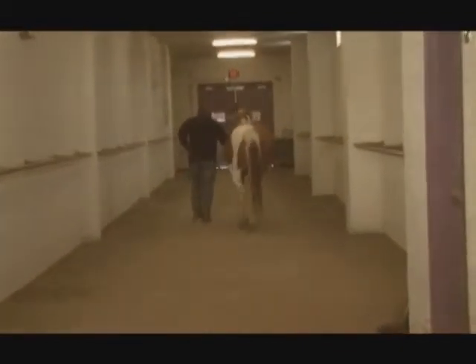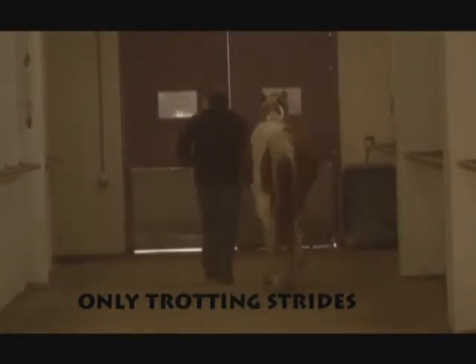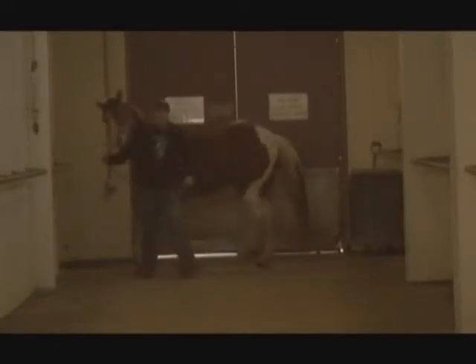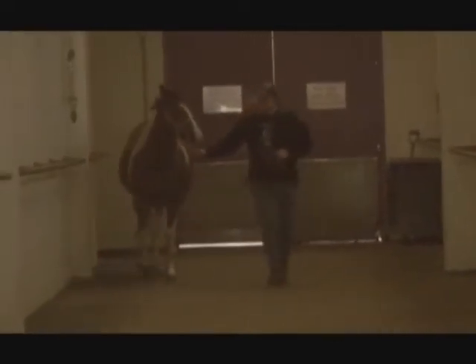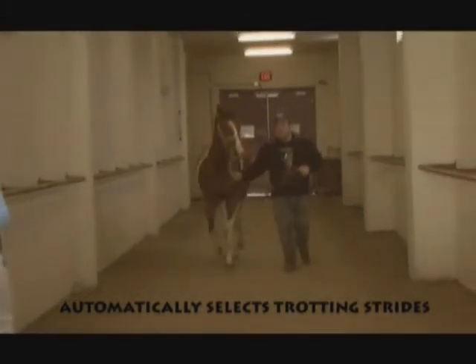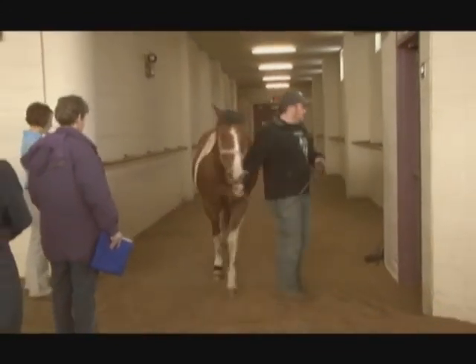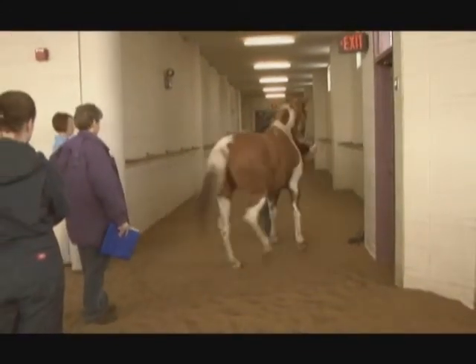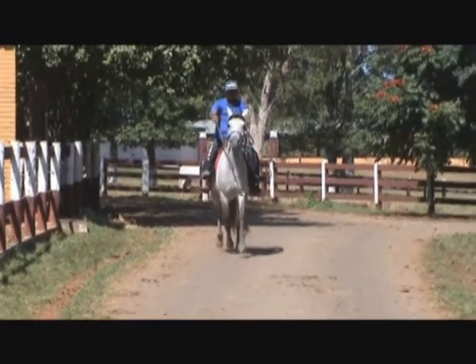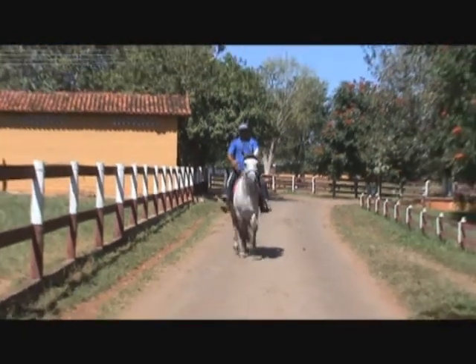Lameness Locator's lameness evaluation is based on the trotting gait. When the horse is not trotting, the information it provides is not useful for lameness evaluation. Fortunately, Lameness Locator software automatically selects the trotting strides for the user and analyzes only these strides. Strides during the collection in which the horse is not trotting, for example, when the horse is turning around, or if the horse bucks or breaks into a canter during an evaluation, are not selected and not analyzed.